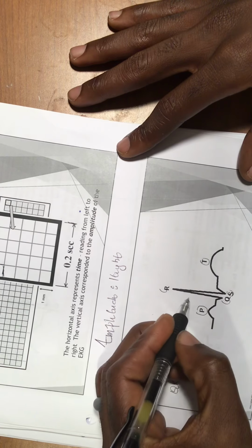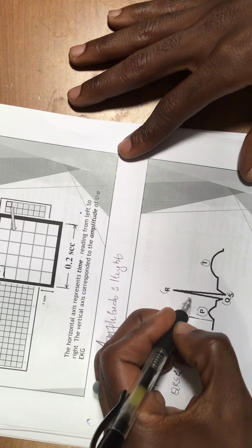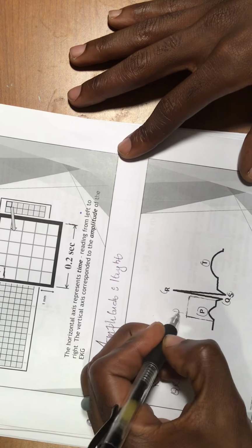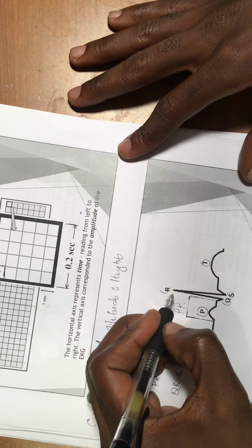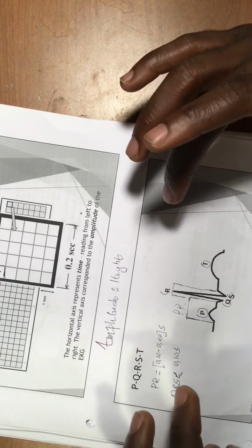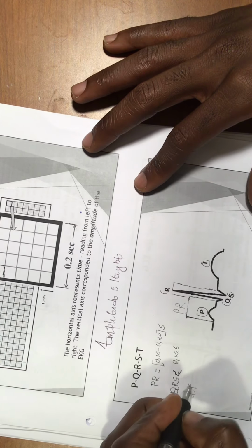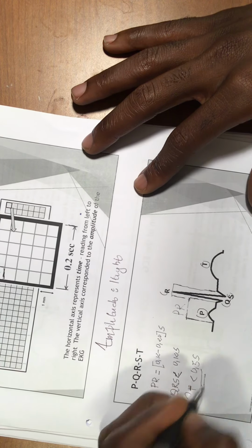If I can draw it, this is here to here. We have the PR interval right here, and right here you have the QRS. We can start it here if you want. The QRS is less than 0.12 seconds. This is really important to know about. And we were talking about the QT interval. If the QT is longer than that, you're going to have torsades de pointes, or you're going to have a cardiac arrest. This is really important to know.